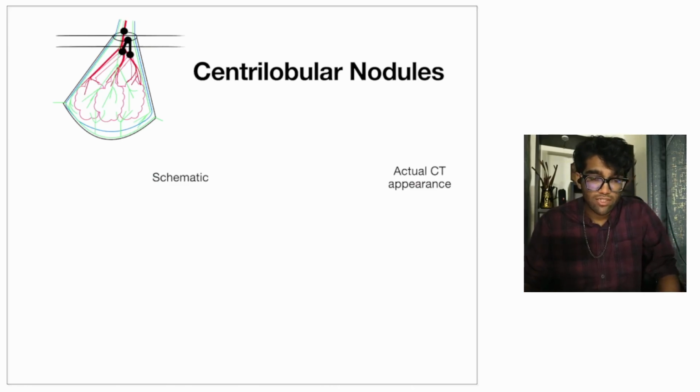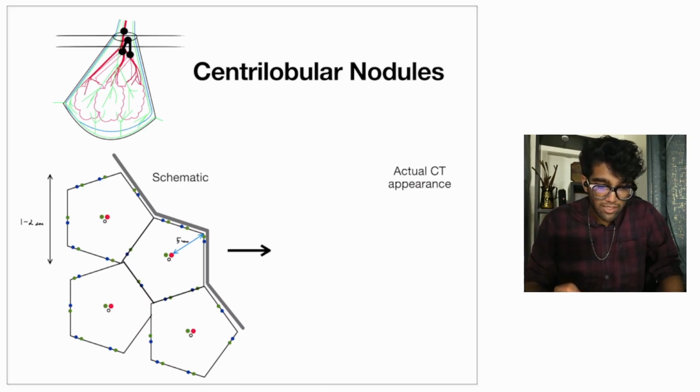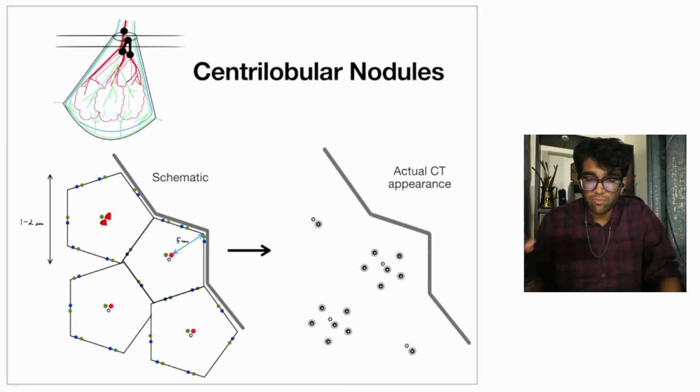So it's a high resolution CT, so 1 millimeter cuts. Now we get images like this. Okay, and what would the images look like? So the images in this particular scenario look rather similar if you see this. There would be a thickening here, or there may be a thickening here, and like I said, in a normal circumstance I'm not going to be able to differentiate it.